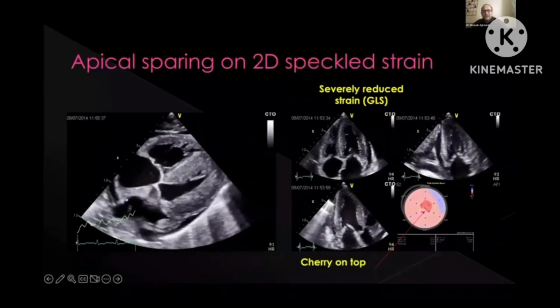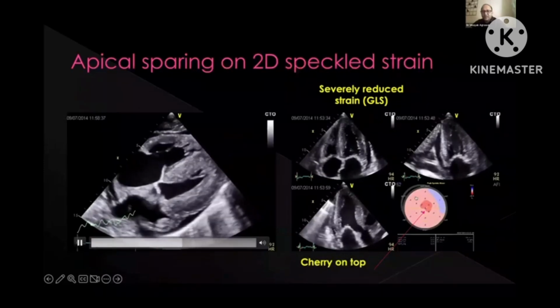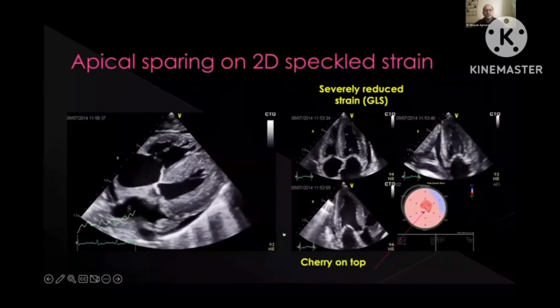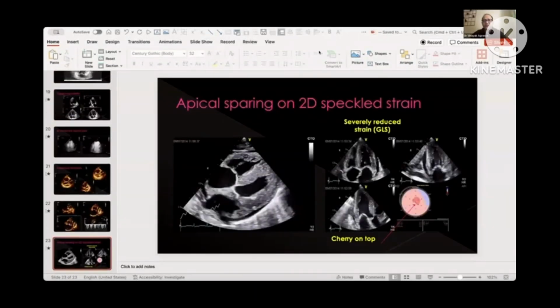These are very classical cardiac amyloid pictures where you can see a cherry-on-top appearance on strain imaging. So not only will we be covering the basics of echo, but we will also show you cases interspersed in between to keep it interesting. So in this course, I'm sure it's going to be quite informative and will have a lot of structured orientation to it.